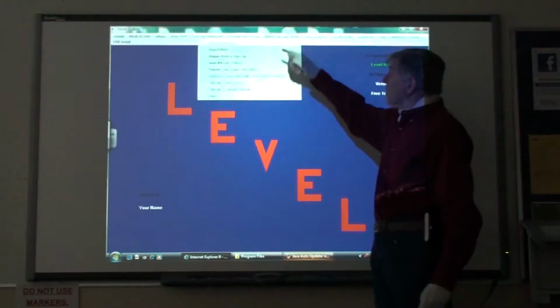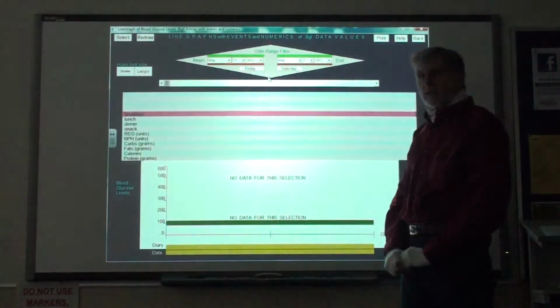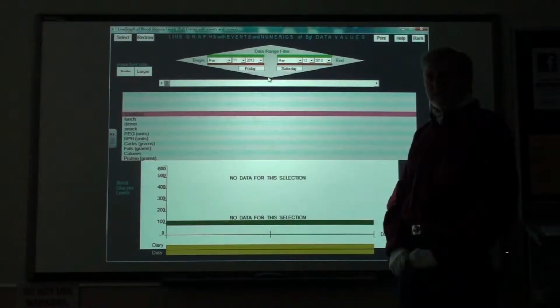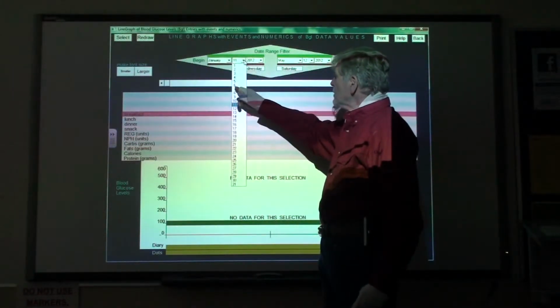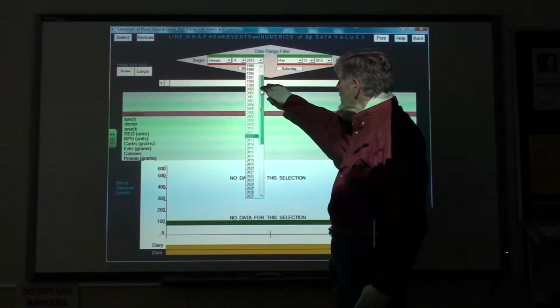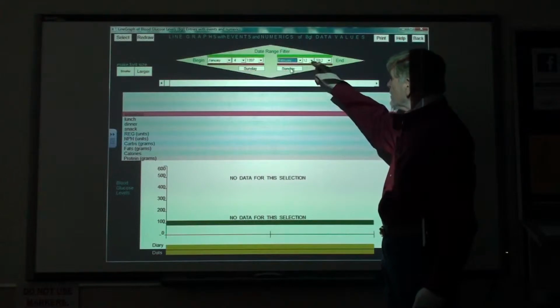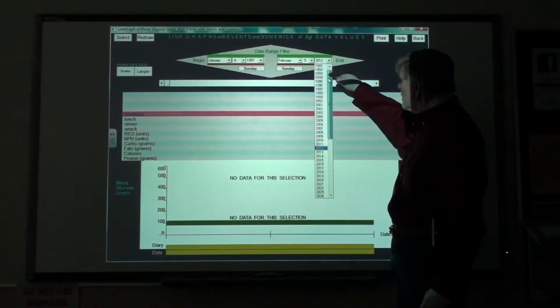So under blood glucose levels, we will go to a line graph with events and numerics. There is some test data to illustrate the point about to be made, and it is contained in January on the day 4 in the year 1997, stopping on January 5 in the year 1997.